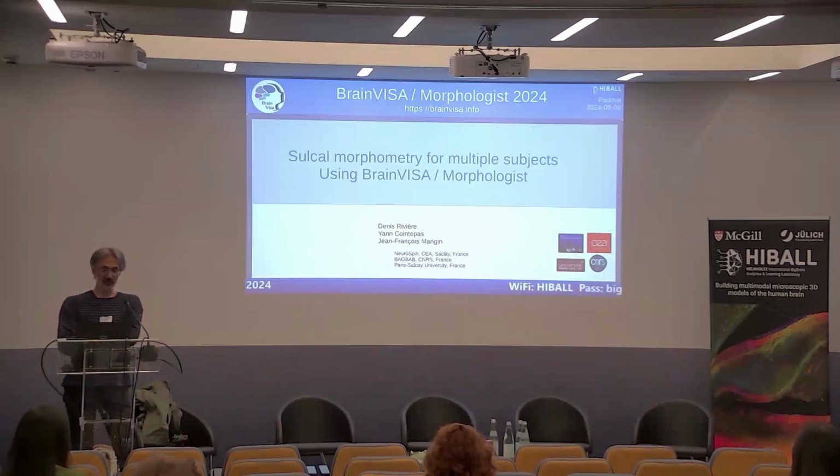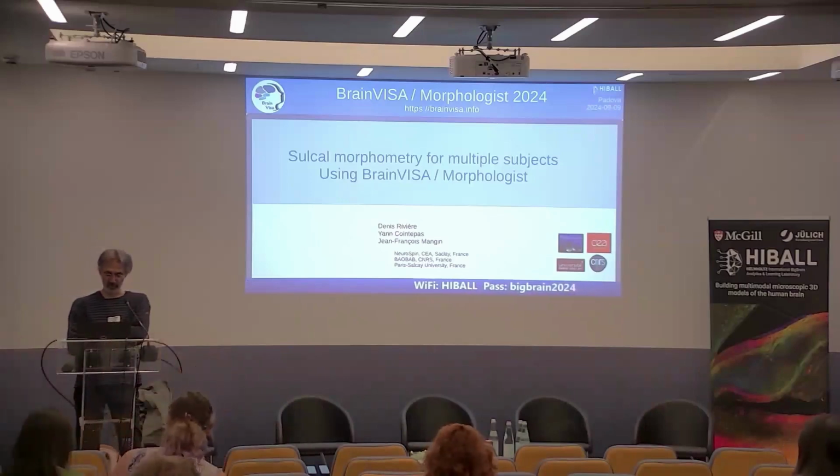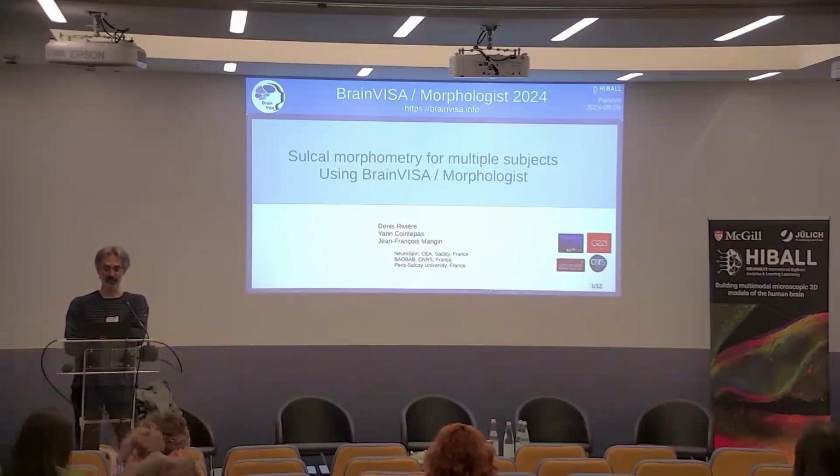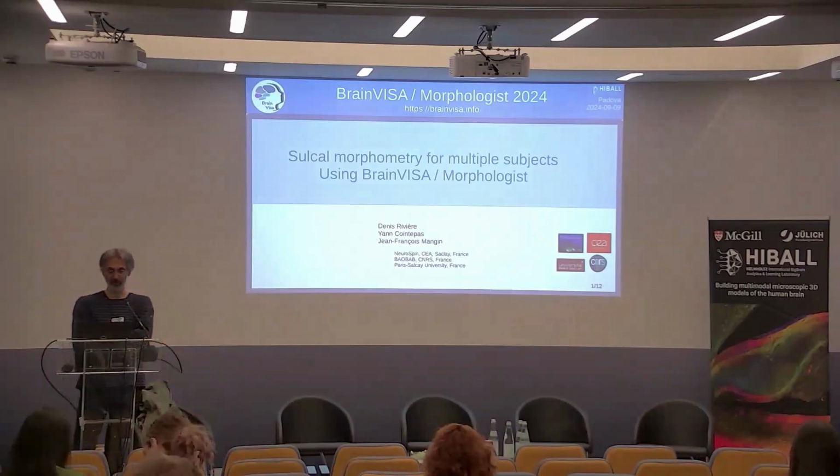We have been developing for a long time now a software suite called BrainVisa, which is freely available on the website brainvisa.info. And I will demonstrate today the use of the Sulcal morphometry toolbox, how to use morphometry of the cortical sulci for multiple subjects using this toolbox.